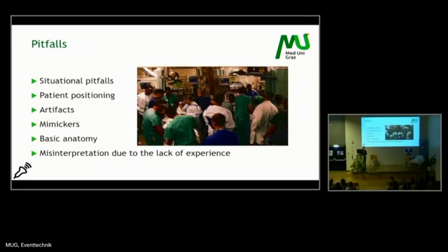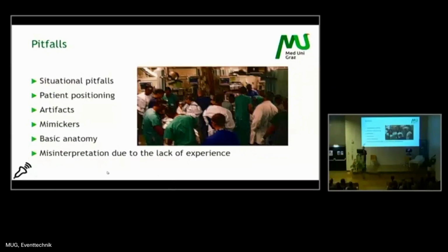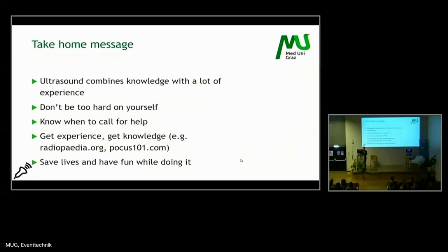Basic anatomy can be challenging. Everybody has heard about situs inversus and stuff like that. Know that sometimes there can be rare things, and be aware that it isn't always true what you might see. And of course, probably the biggest thing in ultrasound in general, experience is everything. So don't be too sure if you're not that experienced, because sometimes misinterpretations, especially in eFAST settings, can happen.